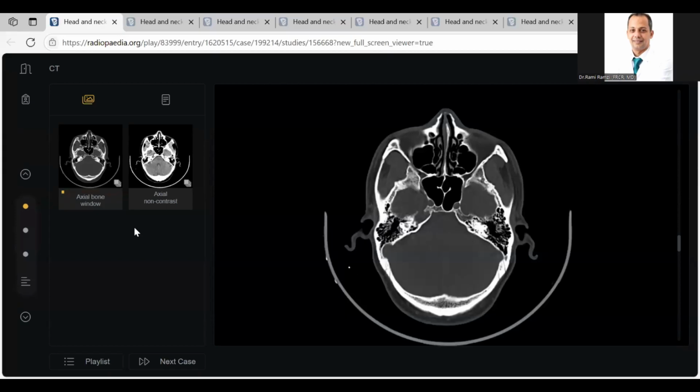Sorry, sir, what was your question? I didn't hear it. You talk about the mastoid air cells. This is very good. Talk about its neighbor. Both mastoid air cells appear to be symmetrical, and there is no fluid density or opacification of the mastoid air cells. But there is resorption of some of the septa in both mastoid air cells. Look at the neighbors.